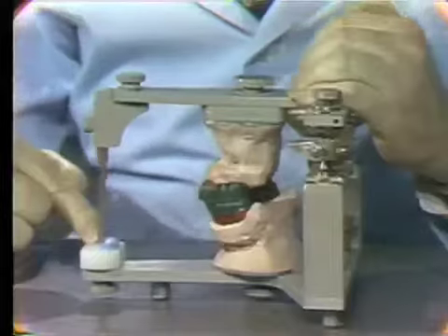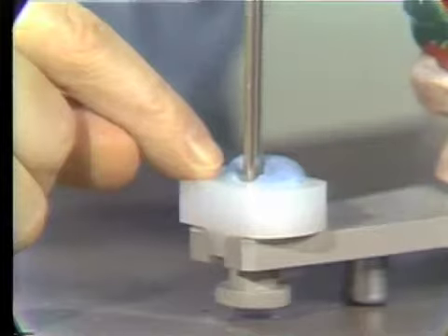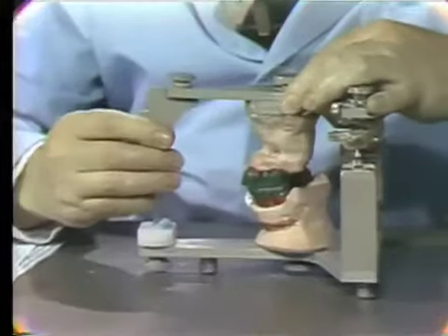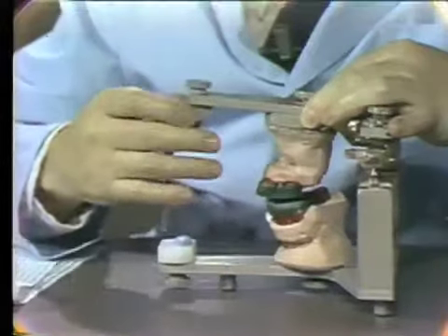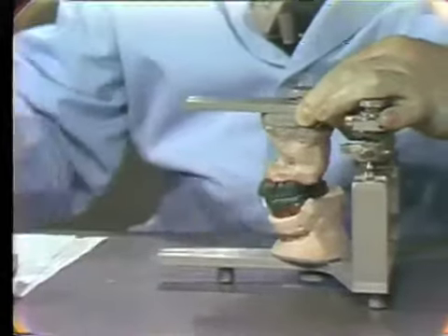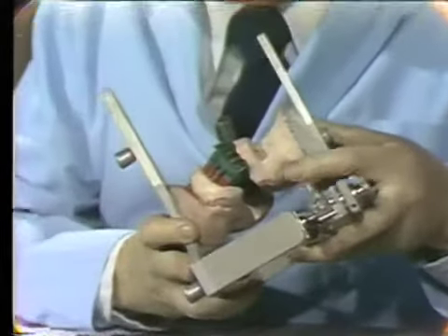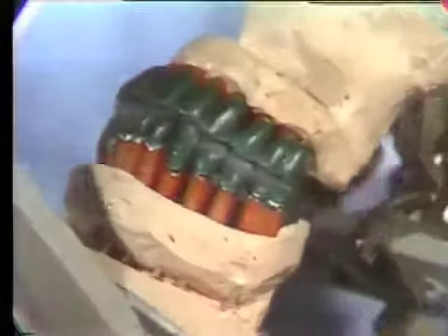To determine the guidance, the laboratory technician was asked to copy the guidance that we sent on the incisal table. To see if this guidance is sufficient to clear the posterior teeth, we'd want to remove the incisal pin from the articulator so that we could check the actual guidance in the wax. Be careful not to rub these too hard or you'll wear away the guidance, but carefully check to see that the anterior teeth provide the desired guidance on the posterior teeth.